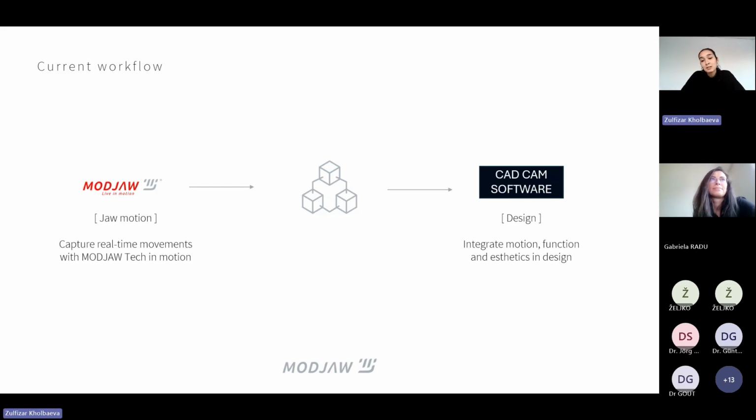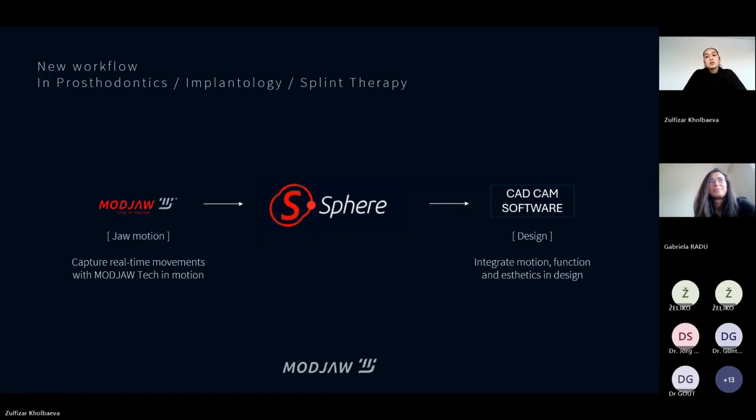And so you will see Sphere is a platform for MODJAW users, of course, but also for the dental technicians that are working with you on your data. So we will see today the two main workflows using Sphere and how you can integrate Sphere in your workflows using MODJAW and using CAD/CAM software. Usually we'll talk about ExoCAD or 3Shape Dental System.